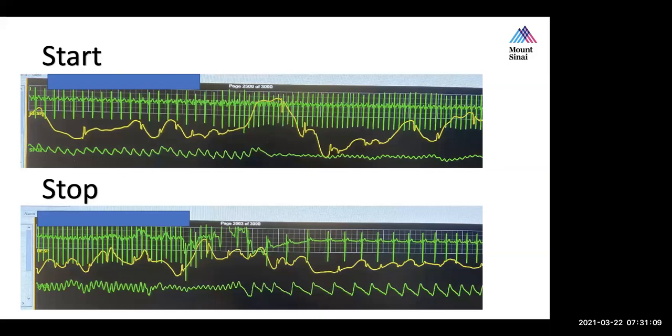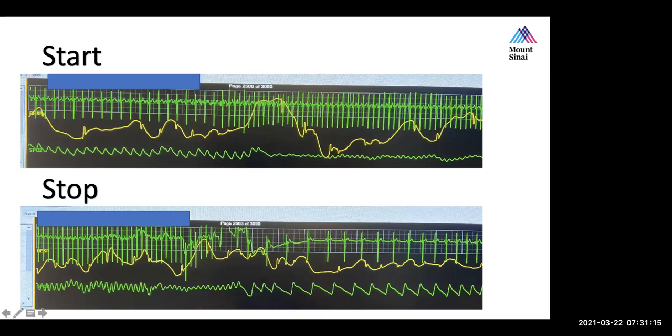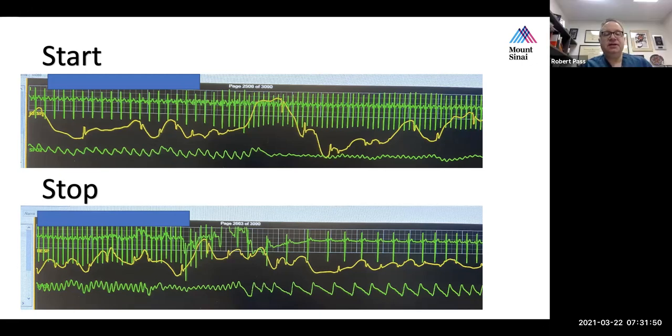Good morning. Good morning. I see a narrow complex tachycardia, as mentioned, with a heart rate of about 300 per minute. That abruptly started and abruptly ended with adenosine, which I believe the mechanism would be reentrant. In a 9-day-old baby, I would say that it's most likely an ORT. That's correct. It is most likely ORT.